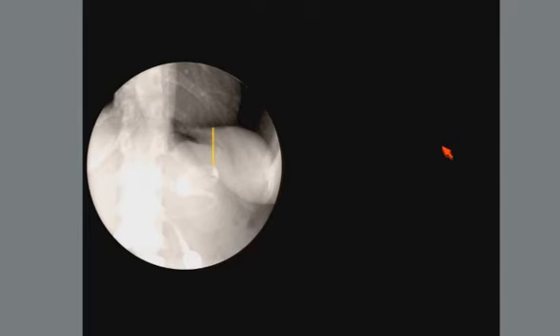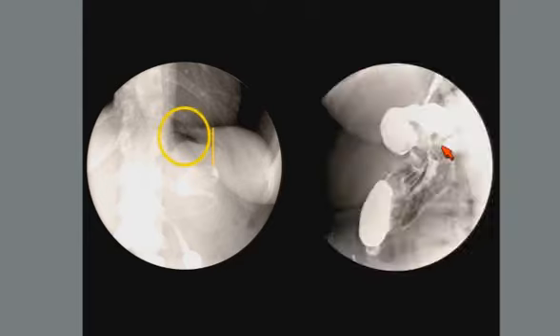That's another finding, and actually a more sensitive finding for slipped band, and also an air fluid level in the proximal pouch. And that was confirmed with fluoroscopy in contrast, and you can see here the band has slipped distally, and you have proximal retention. This is another patient with the O sign of a slipped band that's completely obstructing the proximal dilated pouch.